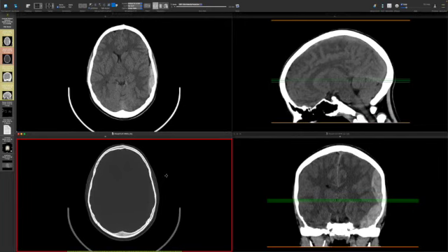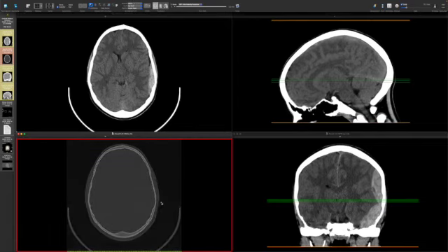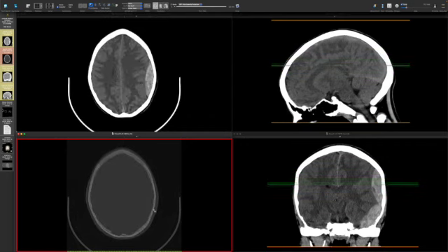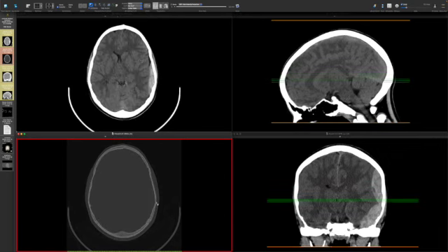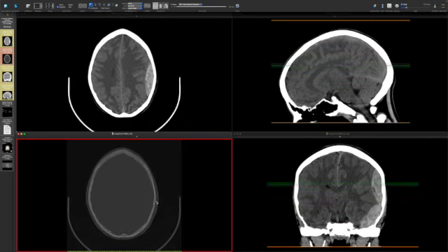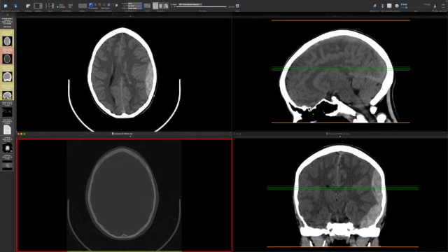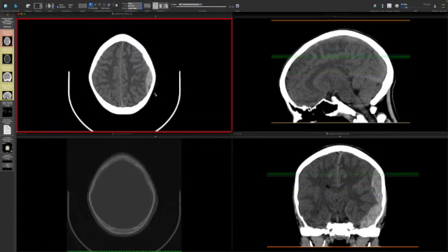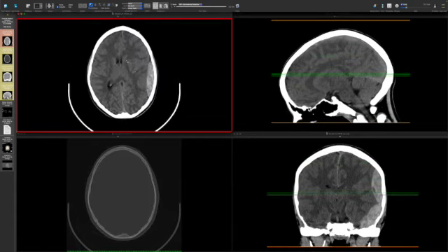It's presumably related to an arterial bleed. There's a very subtle associated skull fracture here that you can see on the bone windows. If you just follow this, there's a line down here. There's this little extra line that's a hairline, non-displaced, non-depressed fracture. That's super hard to see, but it's right subjacent to where that epidural hematoma is. So that's the associated skull fracture. This one's going to get surgically evacuated because of the degree of mass effect, and in all likelihood, it's an arterial bleed.